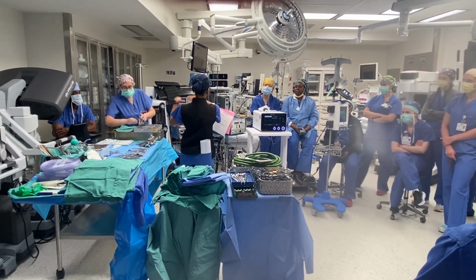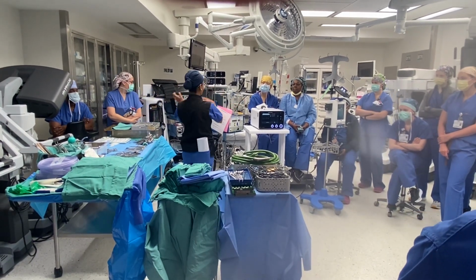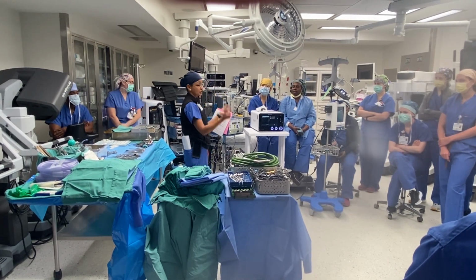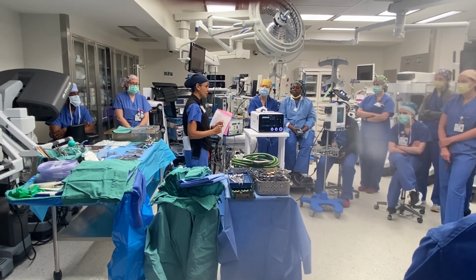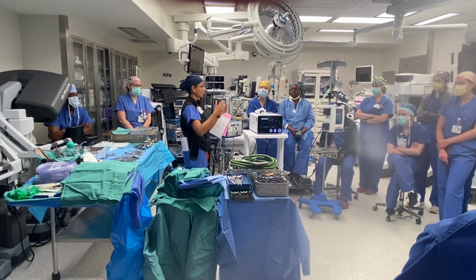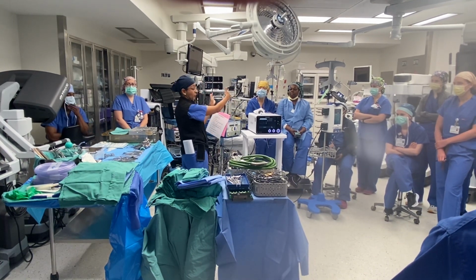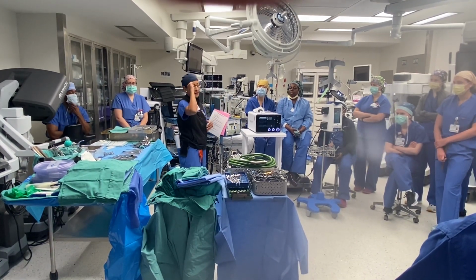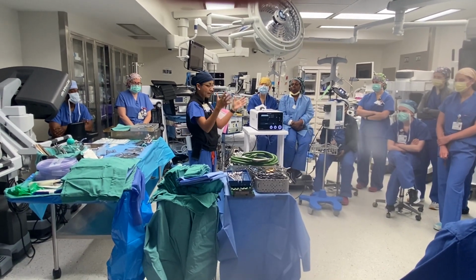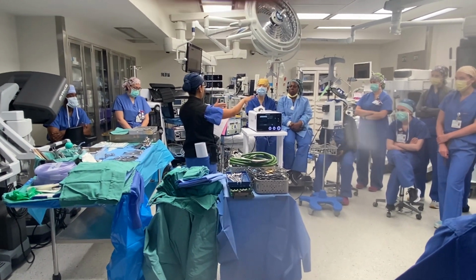In general, all of our equipment setup is at the foot of the bed, so we're always going to turn 90 degrees if we're at the top of the head. For the back of the head, which happens, those are even more time-urgent cases because the brainstem, the most critical part of the brain that controls your heart and lungs and everything, is in the back. For those, usually we'll stay straight, and the patient will be prone. So we're going to think about a right or left case, and again, we're going to turn the bed 90 degrees.